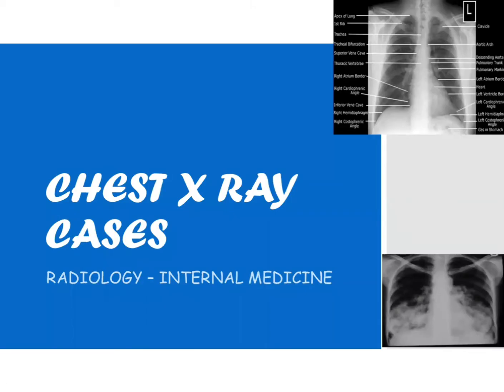Hello everyone. Today we'll be talking about chest X-ray cases. So basically what you need to know about this video is this is not an introduction on how to read the chest X-ray. There is another video that I've uploaded that talks more on the introduction on how to read a chest X-ray. So in this video we'll just be talking about a few common cases such as pneumonia, tuberculosis, pneumothorax, and such other cases.